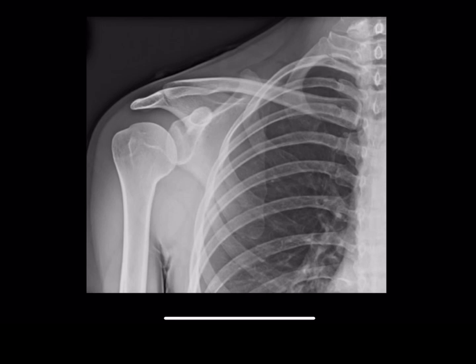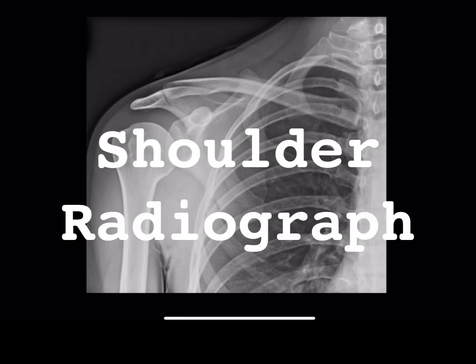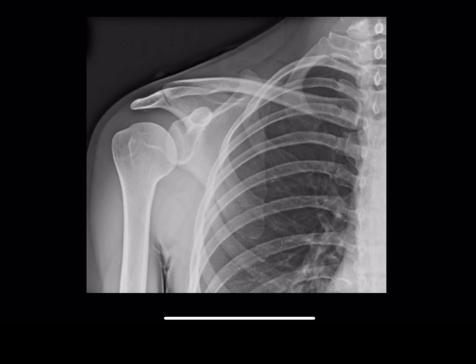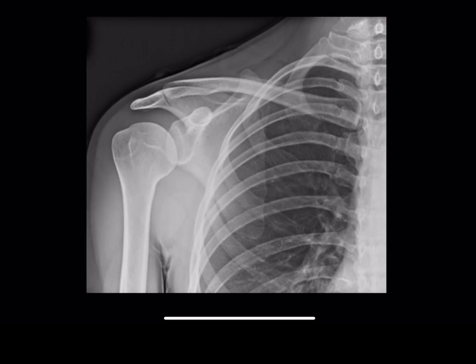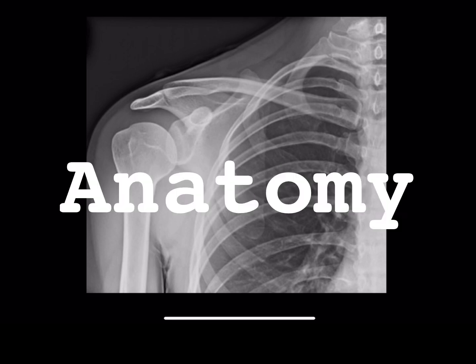Hi guys, today I will be sharing with you about shoulder radiographs, more specifically about shoulder radiographic anatomy, approach to reading the shoulder radiograph, and the common pathology seen in shoulder radiographs.